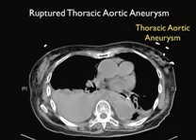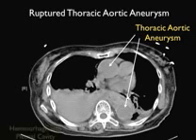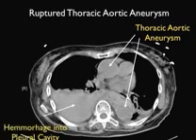Here's the accompanying CAT scan from that same patient, and interestingly enough, now we can further delineate what's going on here, and we see a very large thoracic aortic aneurysm that involves both the ascending aorta and the descending aorta, and we notice here the presence of a large amount of hemorrhage. Interestingly enough, this hemorrhage is not into the usual left pleural cavity, it's extending over into the right pleural cavity. So this patient went directly to the operating room for stenting and did survive.